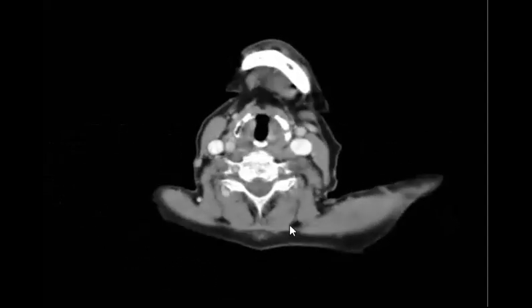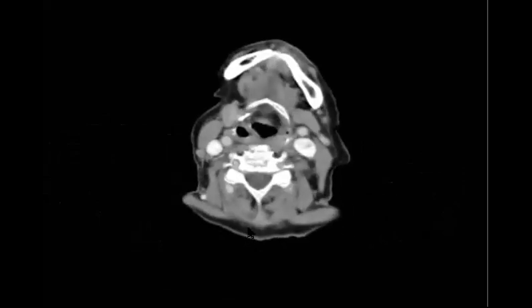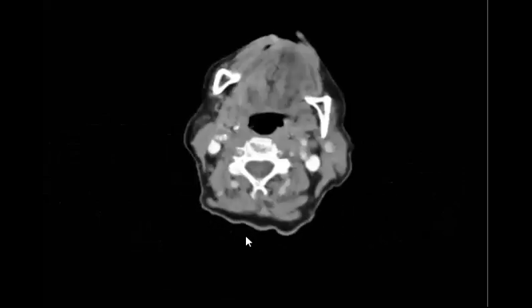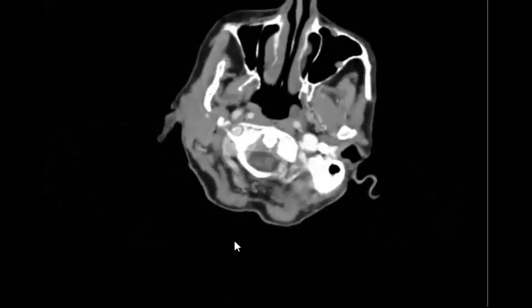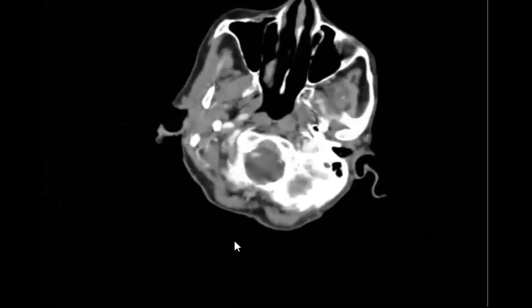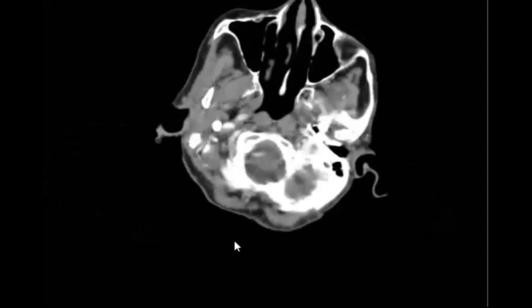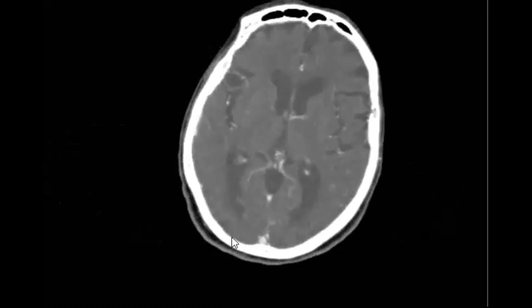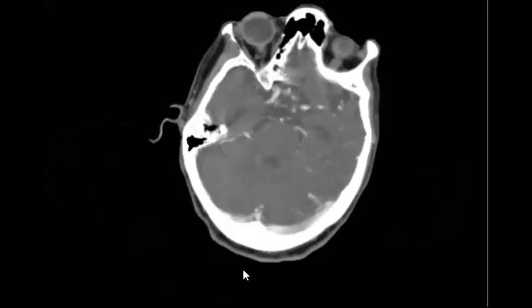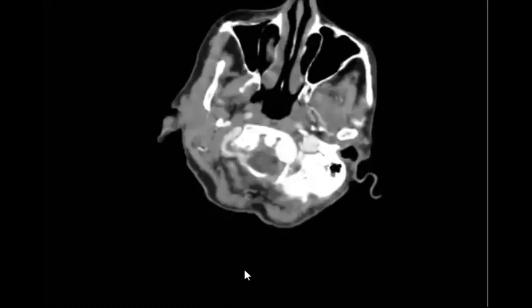No, I don't mention diagnosis. I just want you to describe the abnormality. Where is it, and what is it? Maybe what is it is okay. Yes, soft tissue lesion, but wait, where is it? Nirmin, thank you, but where is it? Okay, perfect. Our biggest star Nirmin today.